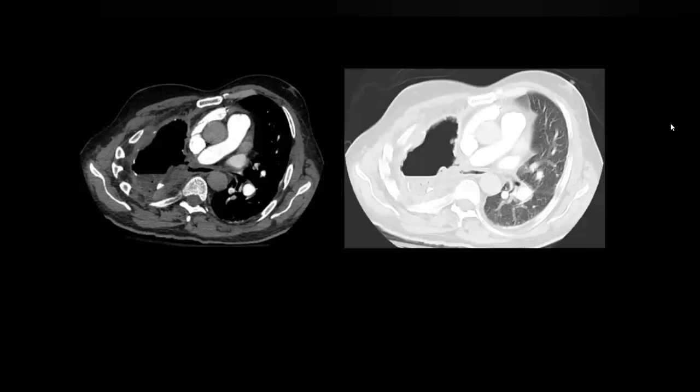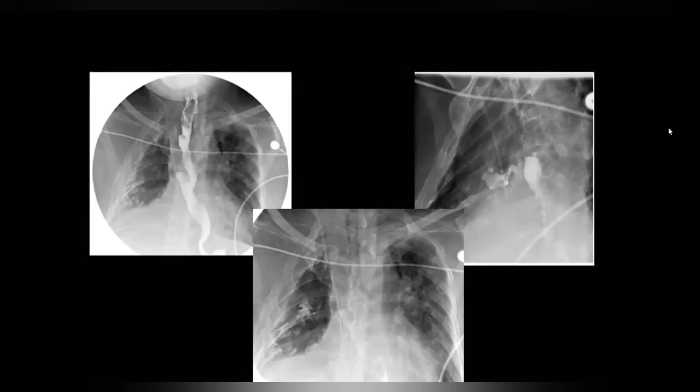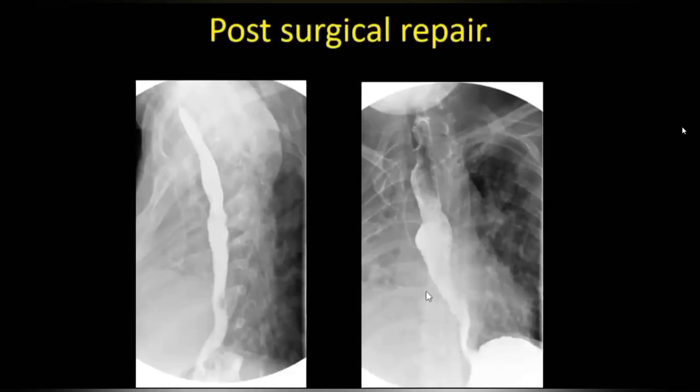Esophagoscopy, or an upper GI barium study. So do you see any contrast leak? Yes, the contrast leak is very evident, particularly in the lateral oblique image, in which I can appreciate a linear tunneling of the contrast emanating from the esophagus and extending anteriorly, which is signifying a fistulous tract between the site of surgery, that is the lung, and the esophagus. So what do you do next? I'll defer the patient for surgical repair.